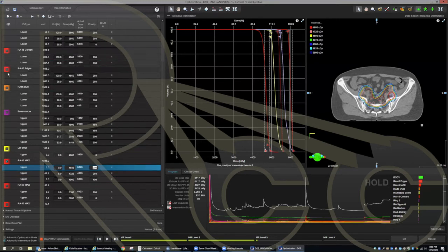Keep my DVH on. So it's still pretty close. You can see it visually, it's pretty close. Something else that you could also probably do is a normalization once the plan is actually done. I haven't seen this tail gotten rid of yet, so I'm going to up this even a little bit more.